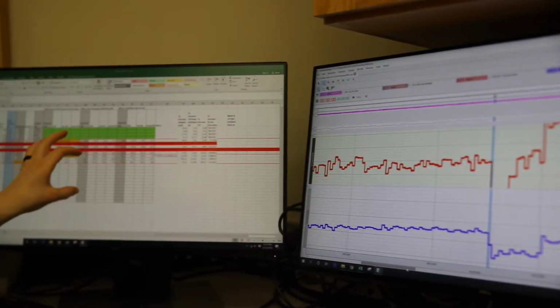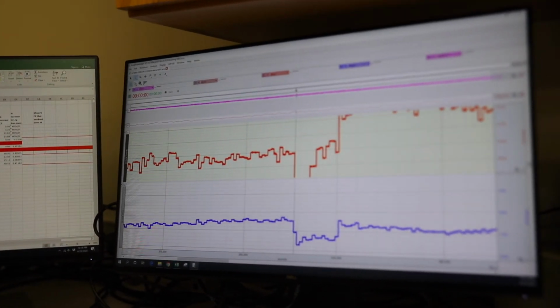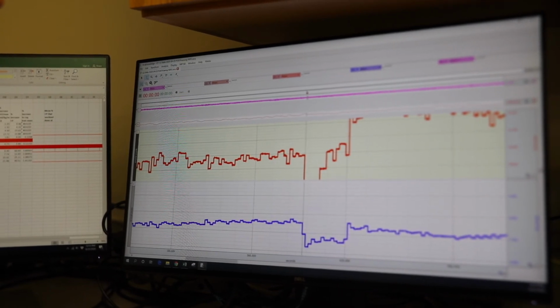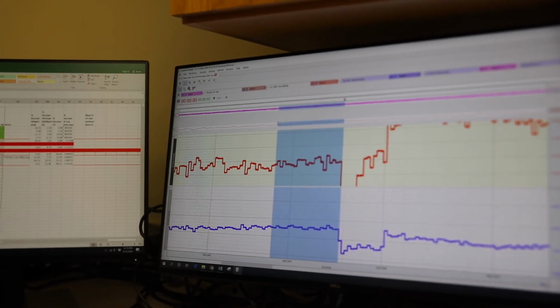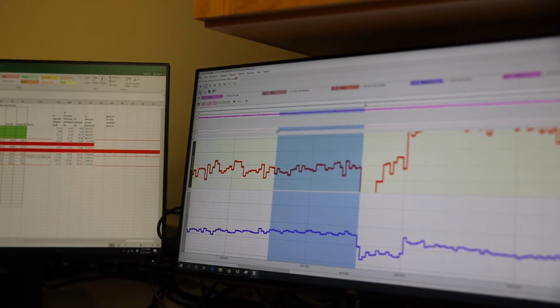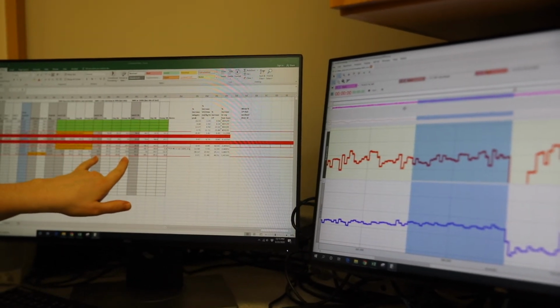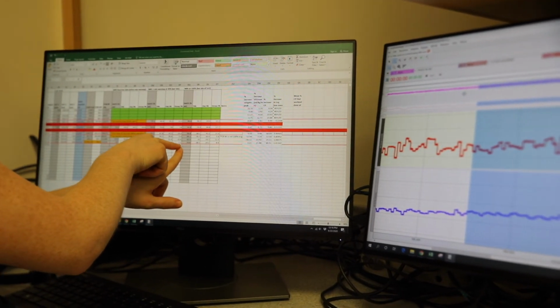So for this data, we want the last 60 seconds again. So again, make sure that your cursor lines up perfectly with that point of the arrow, and then go back 60 seconds. So that's our 60 seconds, and then again we're just going to record these 4 numbers into these 4 cells here. So you can see that the 79.8 gets recorded there, and so on.